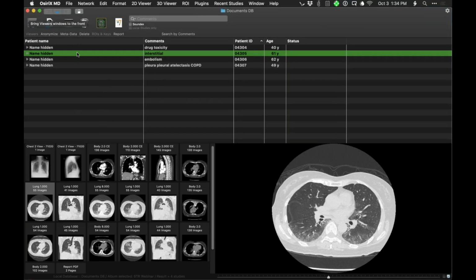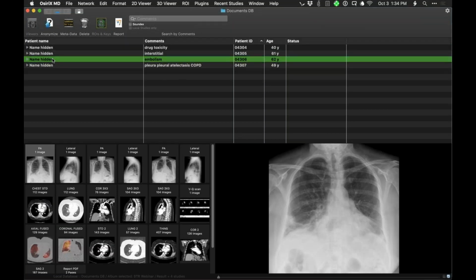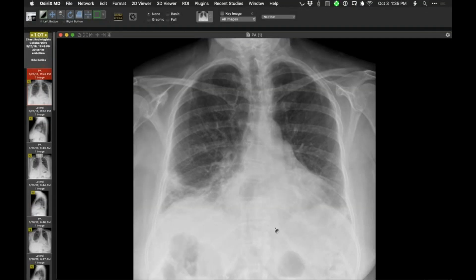All right, let me show you this one next. This one is nice to look at because it's a before and after. So let me start off here. This patient, I don't know when the pulmonary hypertension was initially diagnosed, but she eventually had a diagnosis of pulmonary hypertension.